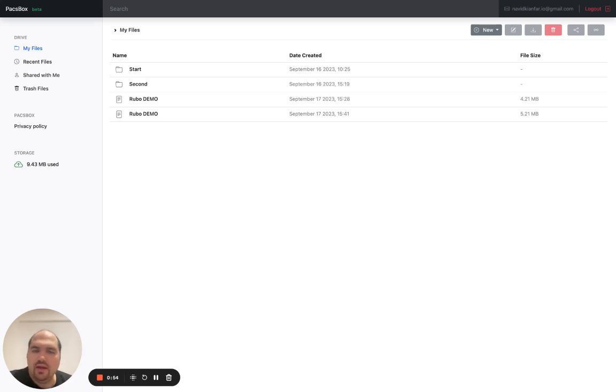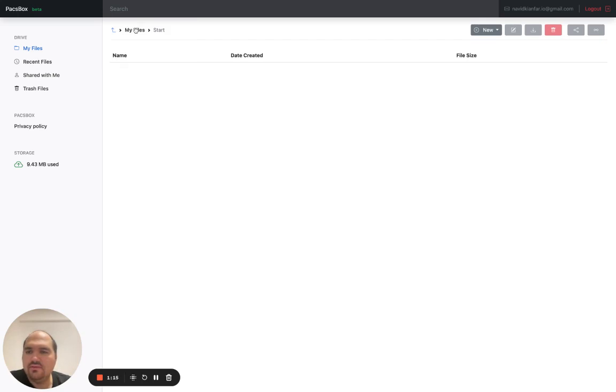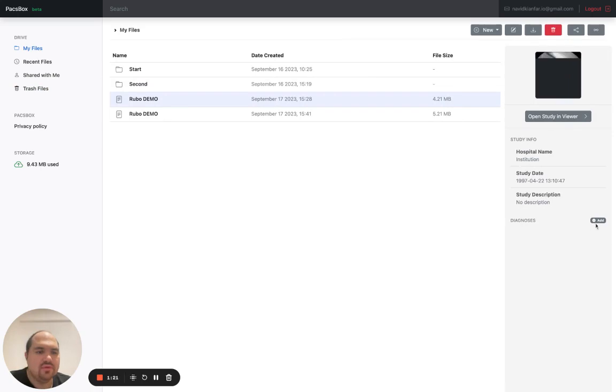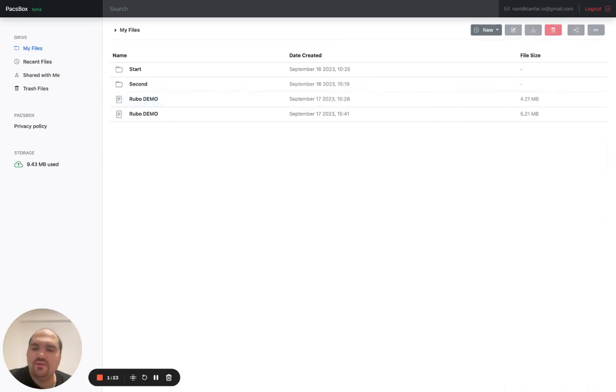So what we've done now within this framework is we just created a fairly concise and clean file structure that you can upload your images onto different folders, create different collections, create different files, and then go through different files and folders, delete them, anonymize them, add a diagnosis if you need to, particularly when it comes to teaching files. All consultants have teaching files that we use for teaching our students and registrars, residents. And the way we thought of this was to make it similar to Dropbox.